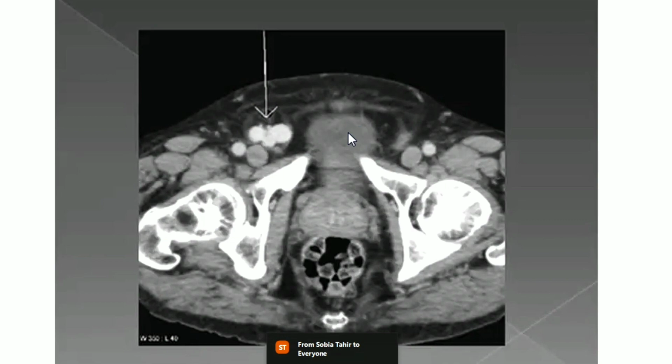To see the full images: scrotal sac to see the testes, and upper abdomen to see the para-aortic lymphadenopathy, or any cause compressing the left renal vein. Do you think it is primary varicocele or secondary varicocele? Ma'am, I think it is secondary varicocele because it is unilateral, and it could be due to a secondary malignancy or obstruction at the upper level.